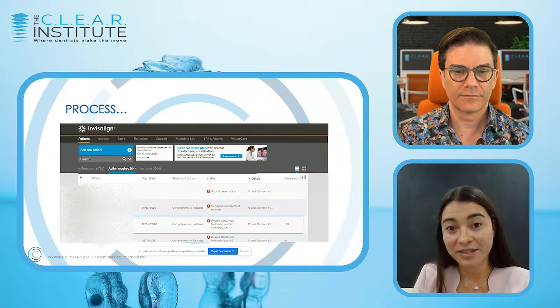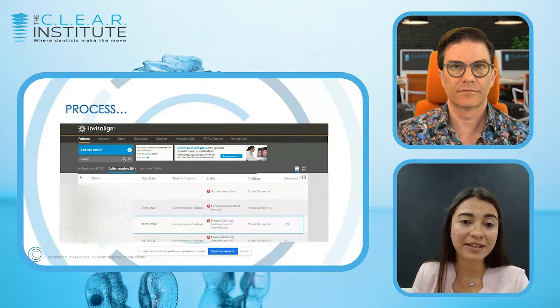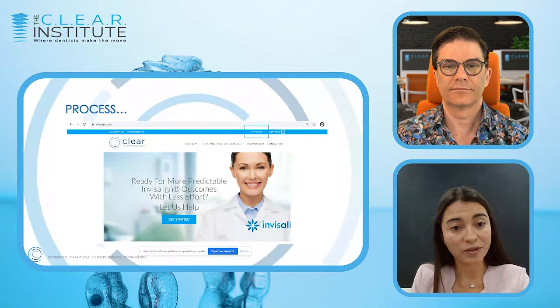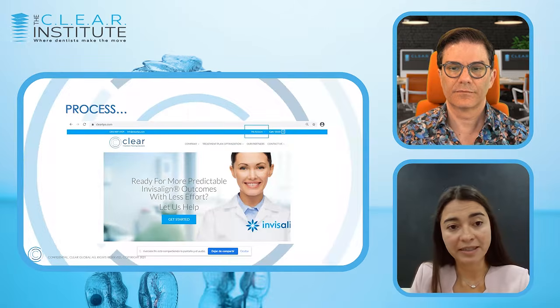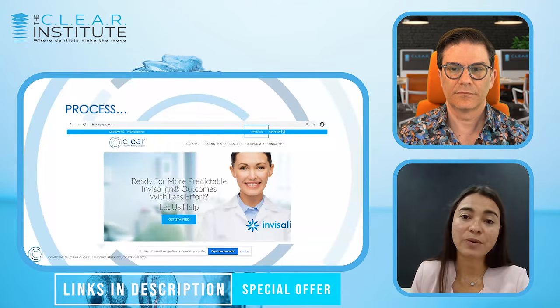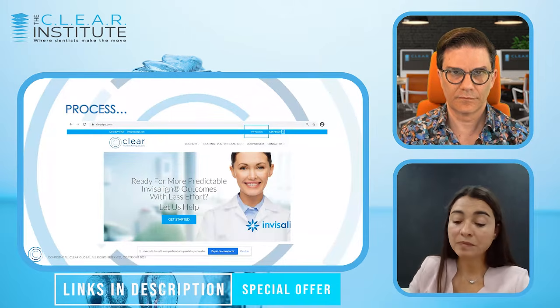So once the doctor has filled the prescription and sent the initial instructions to the C.L.E.A.R Aligner company, a setup will be created. And this is where we can begin our process. This is where we start the optimization of the case. And the doctor needs to send us this order through our website. It's very simple to find at cleartps.com, and into my account, you'll be able to send the case. All you need to let us know is the patient ID, and then we'll start working on the case.